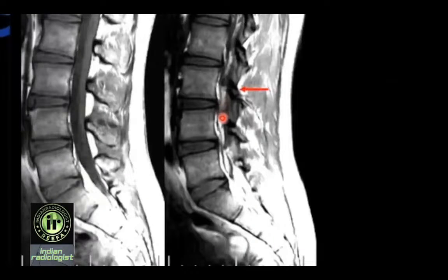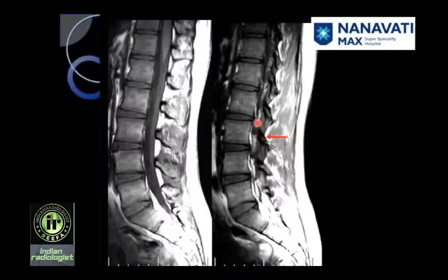Coming back to parasagittal pictures, you have pars, which is quite dark and intact over here. You have crus of the diaphragm and IVC anterior to the vertebral column. This is posterior epidural fat. This person's canal is quite wide, so there is abundant posterior and anterior epidural fat. This is thecal sac, nerve roots of the cauda equina.